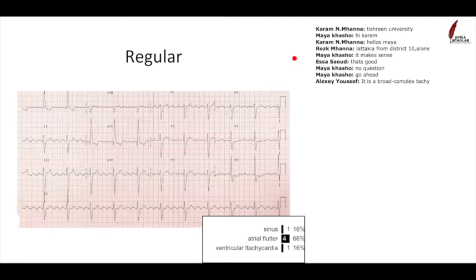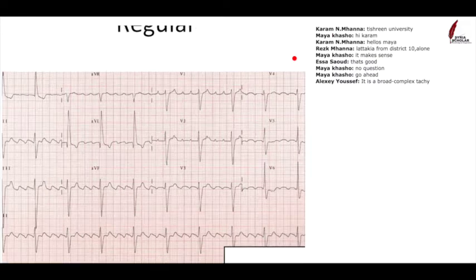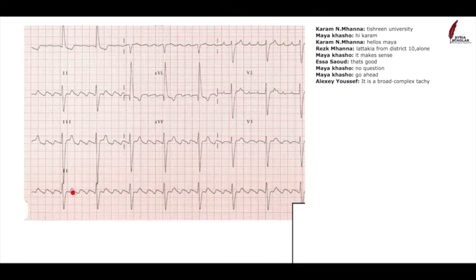So, atrial flutter is when, zoom in a bit. If you look at the heart trace, the baseline, you get this funny, what we call sawtooth appearance, and then you have a heartbeat. And then you have these weird sawtooth waves, and then a heartbeat, and then a sawtooth wave, and then a heartbeat. So this is very classic of atrial flutter.